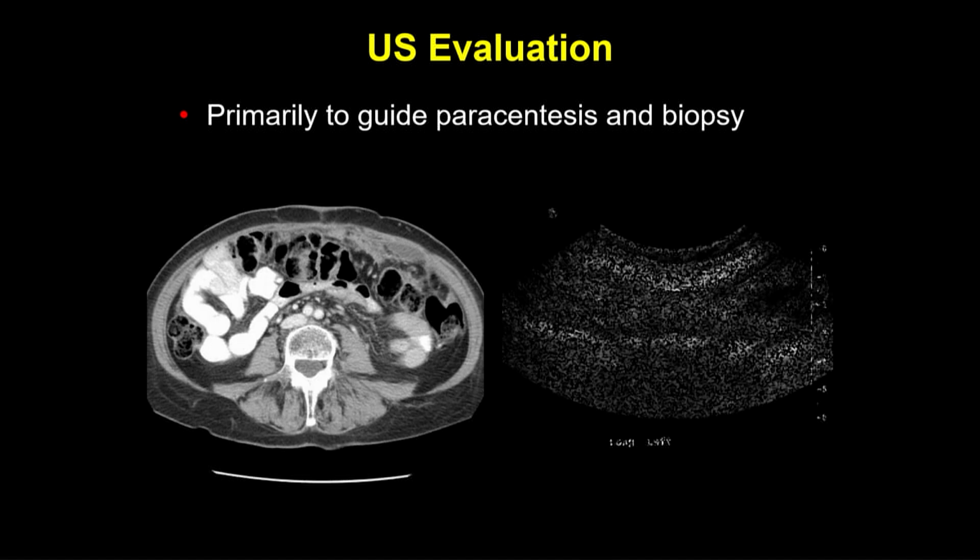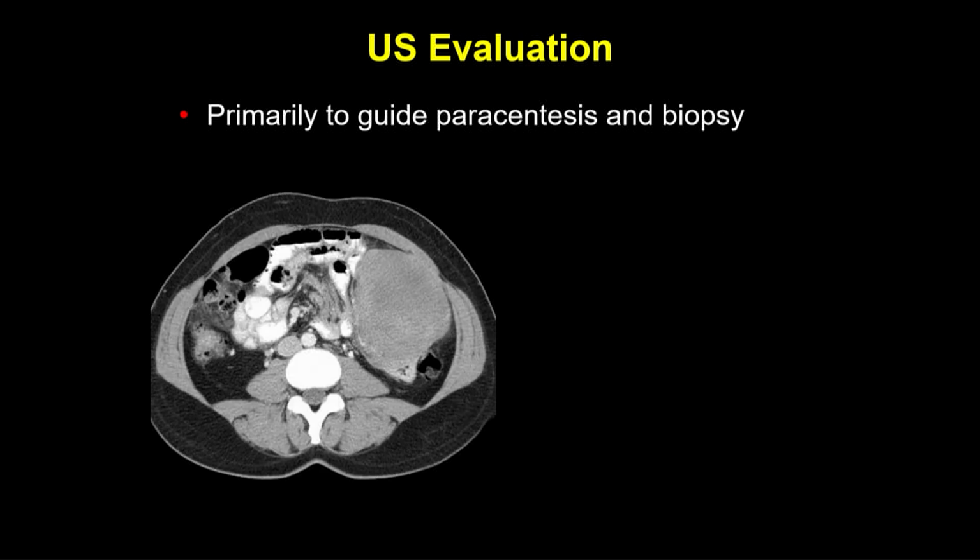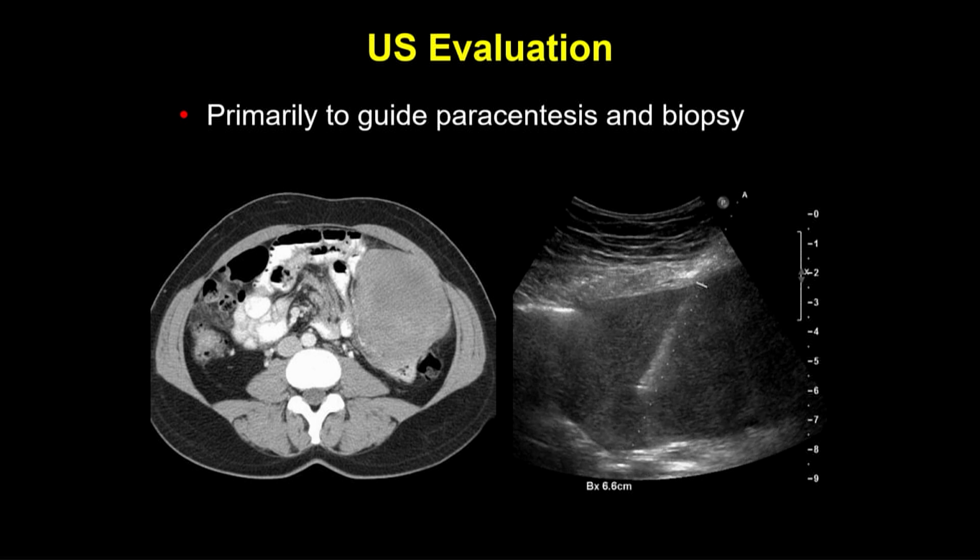Here's just another example. This was, I believe, a case of ovarian cancer, just run of the mill. And again, I always tell the sonographer, okay, look above the belly button. Relative to the umbilicus, I'll tell them where to go. Go left and up, and look around there, and you should see it. And we do a ton of omental biopsies, and we've written papers on that too.